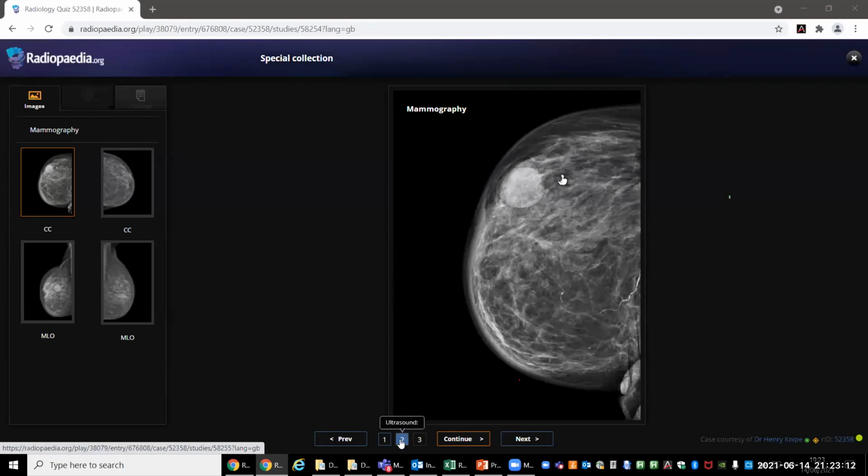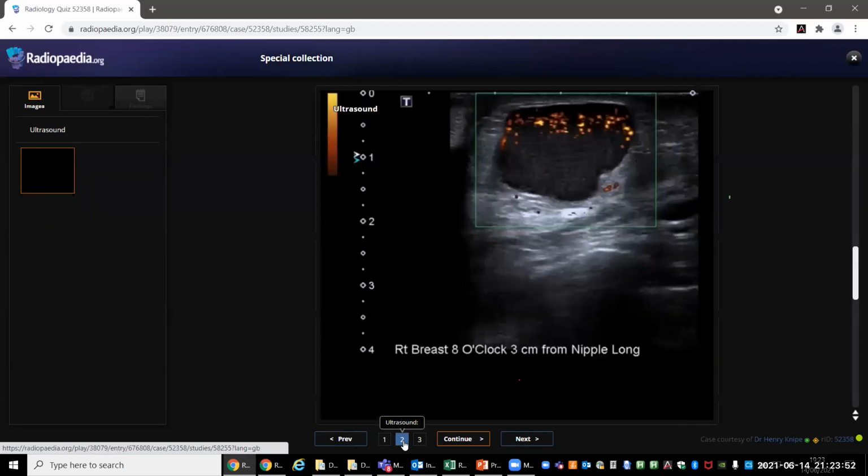So why do you call it BI-RADS 3? The lesion is well defined, round to oval, and it has smooth borders, and there is a thin rim of lucency around the lesion, ma'am. So what is BI-RADS 3? What kind of lesion is BI-RADS 3? The lesions which need to be followed up, or which have a low risk of malignancy, ma'am. So, but you're describing something that you think could be a cyst. It's well defined. Would that still be? Yes, ma'am. Maybe I would first do an ultrasound and then ascertain the nature of the lesion, ma'am.